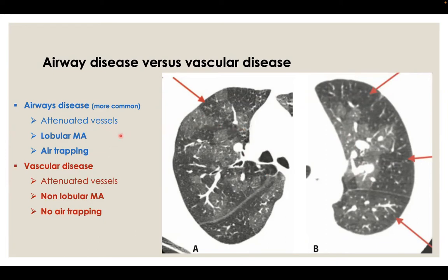By two things. First, if you recognize on the inspiratory scan that the low density areas are lobular in appearance, in this case you don't need the expiratory scan.